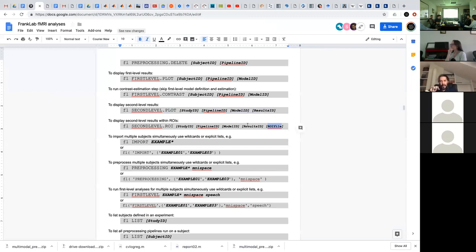There are some additional cases where you might want to have subject-specific ROIs, in the sense that they are not matched by any particular whole brain transformation. So there is neither an MNI space conversion that matches your subject brain to one common space, nor the FS average convention that matches one subject brain to one common space. In some cases, you don't have that whole thing.